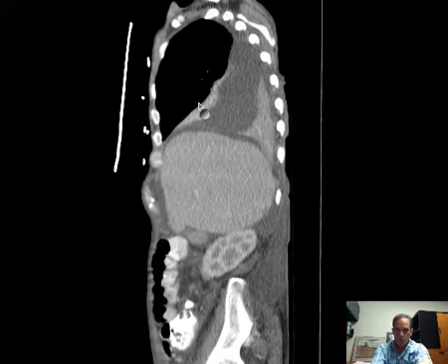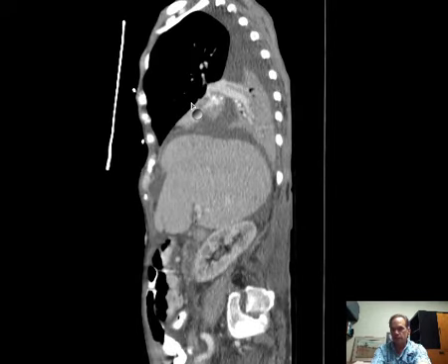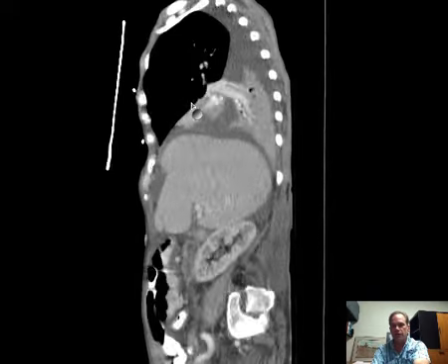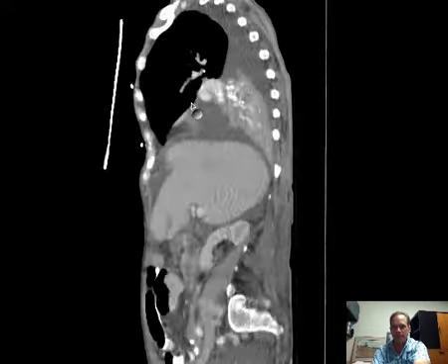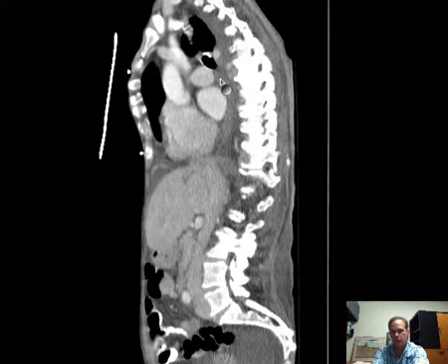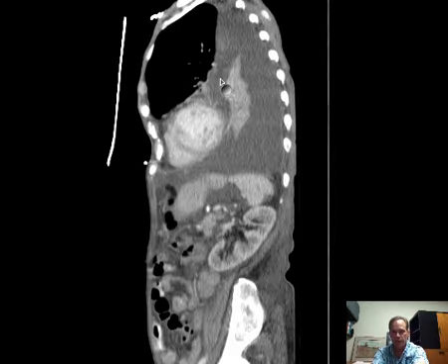So, more detail perhaps than you need at this moment, but it's a way of seeing things so that when you see a chest CT or a chest radiograph, you can start imagining, you can see with your mind's eye what might be happening. And atelectasis and pleural fluid are very common things that we see. Now let's take a look at the other side, see what we have there.